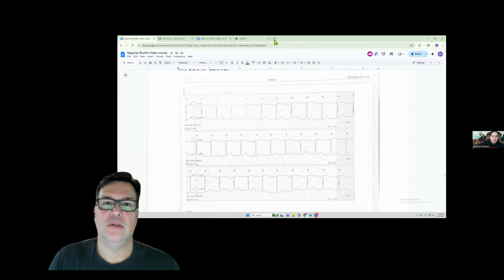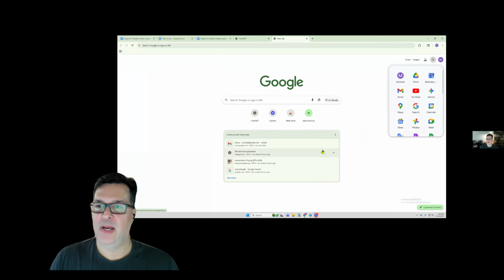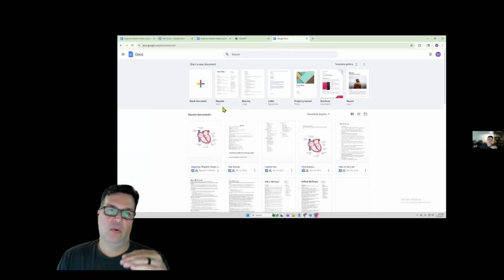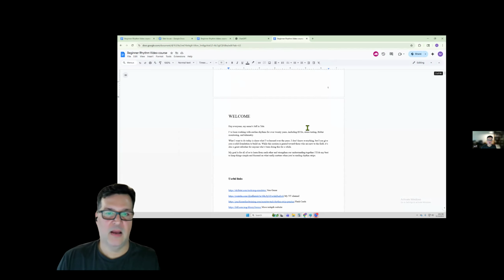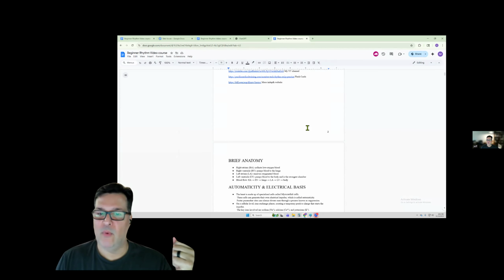Anyways, thank you. So with all these AV blocks, I'm going to open up another page while I'm talking. With all these AV blocks, there's nothing wrong with the SA node, okay? That SA node is firing that P wave every single time like it should be, at 70 beats per minute, whatever it wants to be, right?